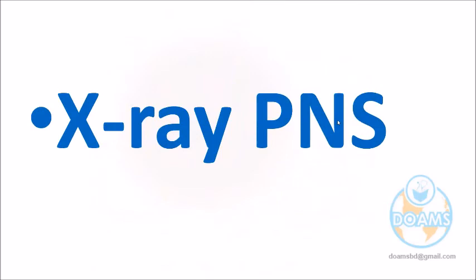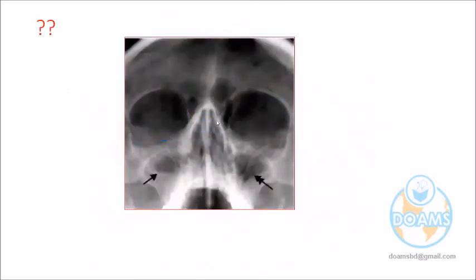Now come to the other X-ray of the PNS. It was a common one, with 2 arrows given. What is your diagnosis now? Sinusitis. No, there's a different diagnosis, doctor, in the right sinus and left sinus. You have to say sinusitis, but can you specify this? Which type of sinusitis? Acute or chronic? Which one is acute, which one is chronic?